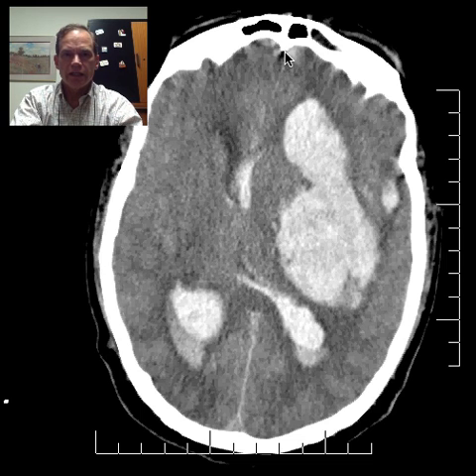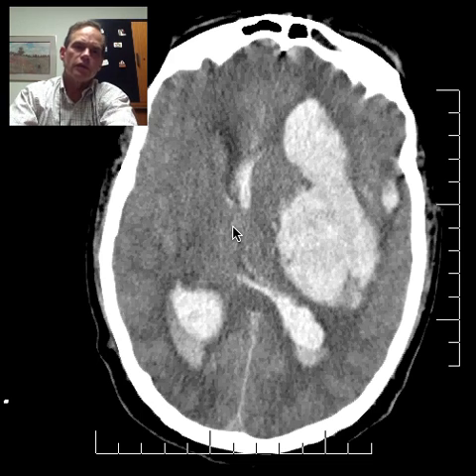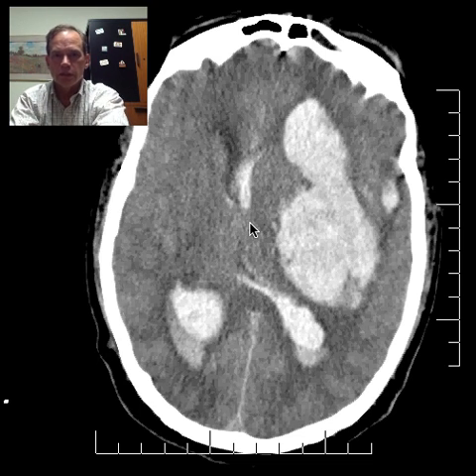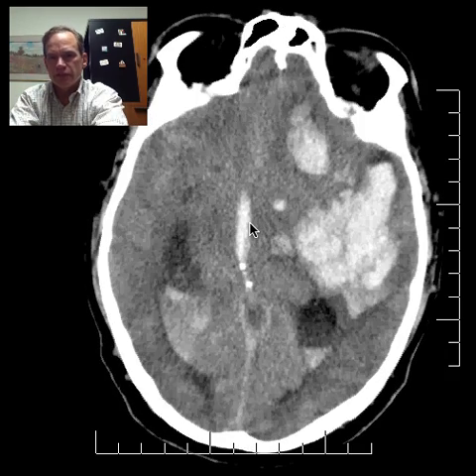And I don't have that tool handy right now, but if you drag a line from here, that little prominence there where you can kind of see the falx connecting, and you go all the way back to here, which is the superior sagittal sinus, in this line here, the straight sinus, then you drag a line along that, and then you see where the midline structures are displaced, and you measure how far that is. And this is way far in short summary. Okay. So huge mass effect.